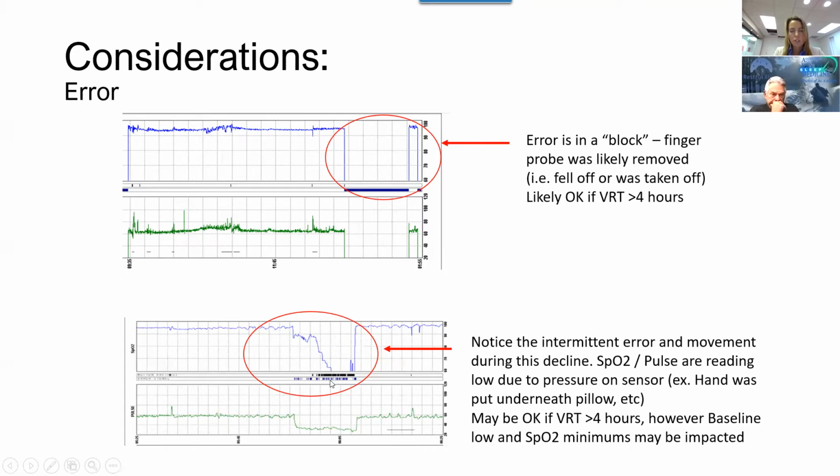So usually when we see something like this where it's not reading very well, we have some intermittent error, and you see something that's, say, almost looks like a 20-minute desaturation, that's oftentimes when the patient is maybe moving around in bed or getting up and walking around, and the sensor detects some signal, but it's not quite good or bad enough to get an accurate recording there.